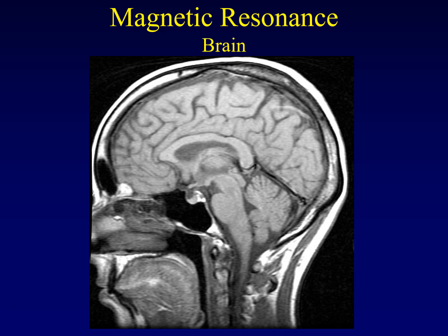But we tend to restrict ourselves usually to the predictable planes of imaging of axial, coronal, and sagittal. Why? Because we understand the anatomy well in those planes, and it makes all of the MRIs look similar, which makes us much more efficient.